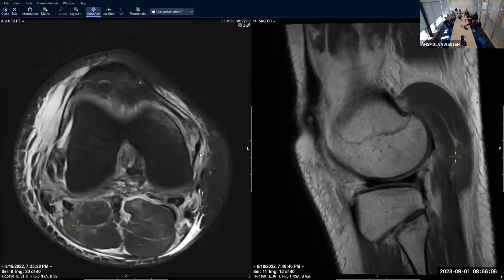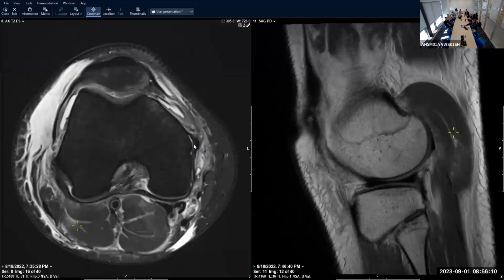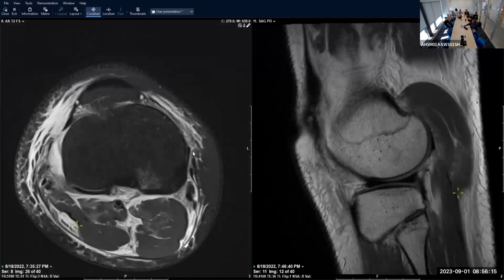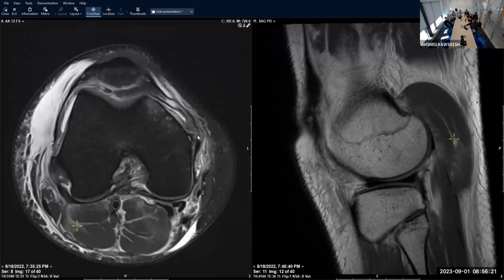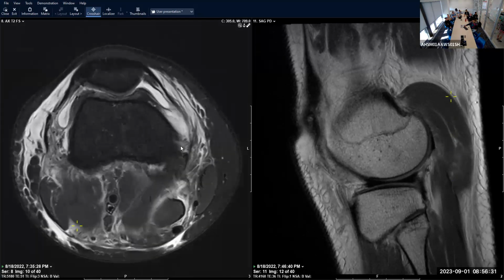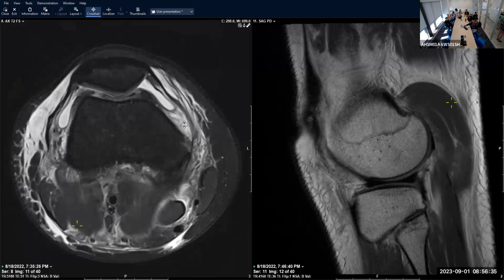For MCL, we can see that there are fibers, right? It starts here and goes down, and attaches to the tibia. I'm not seeing any of these fibers really disrupted. I'd probably call this a grade 1, but I could see someone arguing that maybe some very far anterior fibers are involved. This person's not going to be walking around for a while, so I'd call it grade 1 or 2, it doesn't really matter at this point. Grade 3, maybe then, it has some surgical implications, but.